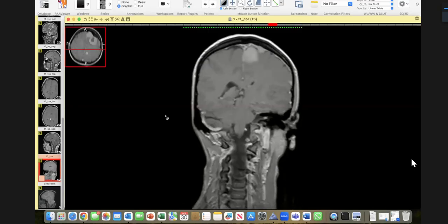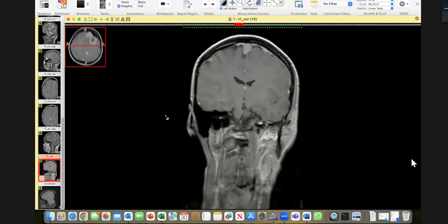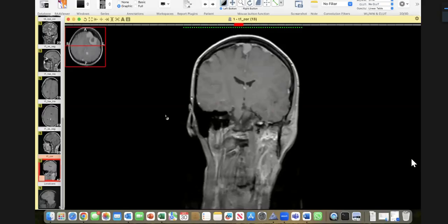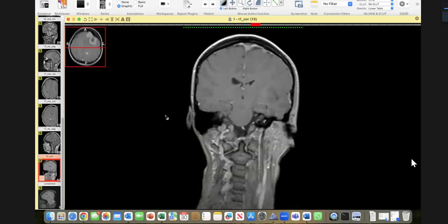I would like to look at the rest of the neural axis to rule out any schwannoma or ependymomas as well, because there was one intraventricular tumor growth as well on the occipital horn of the left side in subependymal location. Which is the most important tumor regarding the definition of NF2? Schwannomas. Of what?